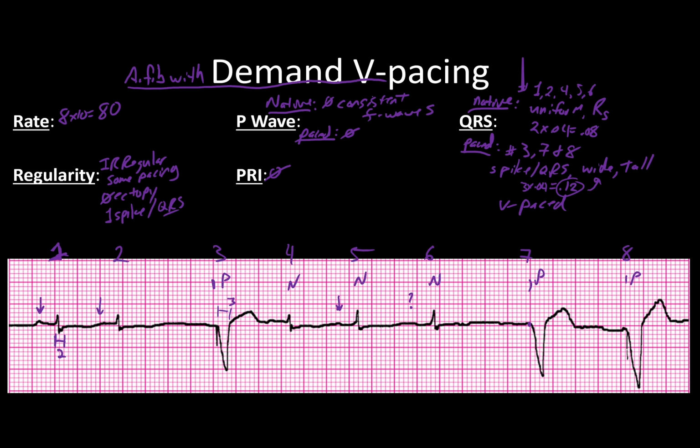What is the rate setting on this? How slow does a patient's heart have to get in order to trigger? To answer that question, I'm going to draw some stuff out, and so it's going to be a little bit of a mess, but just hold on with me here for a second. We'll do the start of the QRS. And so I've measured these out already, so I'm just going to go ahead and write them in to save a little bit of time rather than counting everything out. And this one is 23.